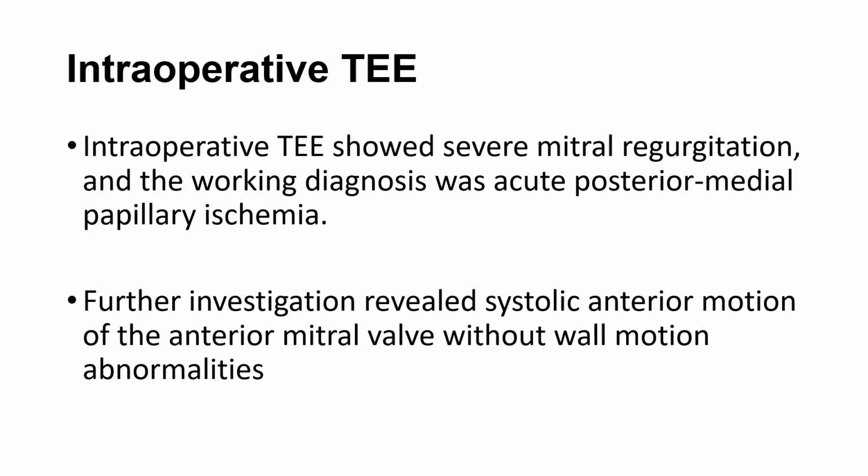This case also shows why it's important to have a PA catheter and the intra-op TEE at the same time, because you can easily identify the V wave on the PA catheter waveform, but not clearly make a diagnosis without a TEE. The TEE is very helpful to make a diagnosis. On the other hand, it might be very difficult to have an immediate sign without having constant analysis of the pressure, which is not very practical in the real setting.